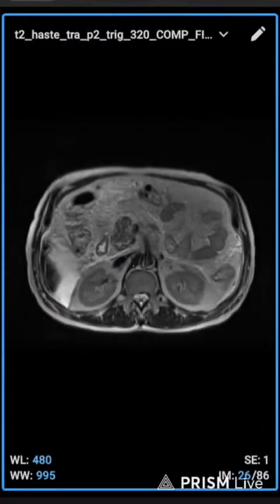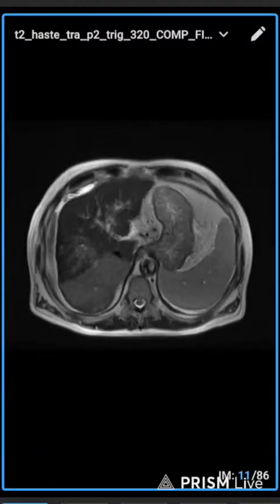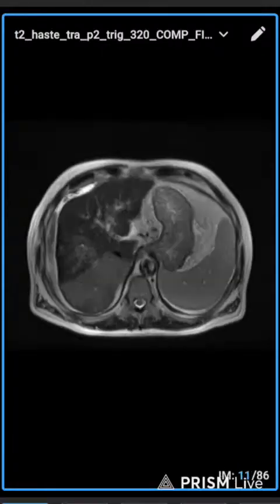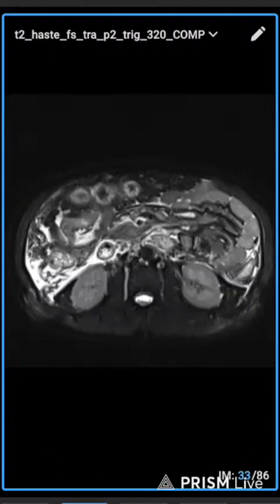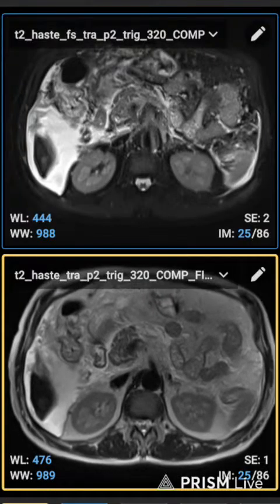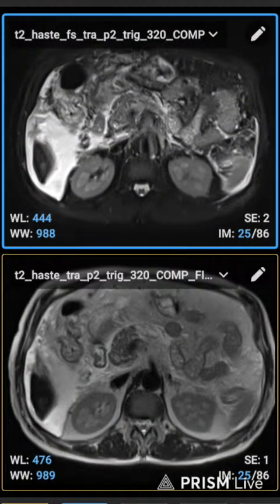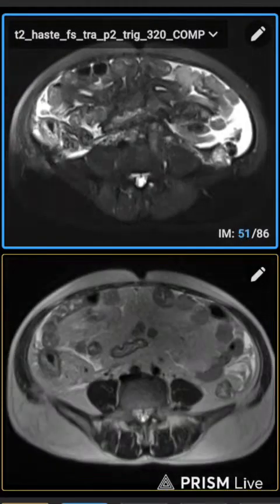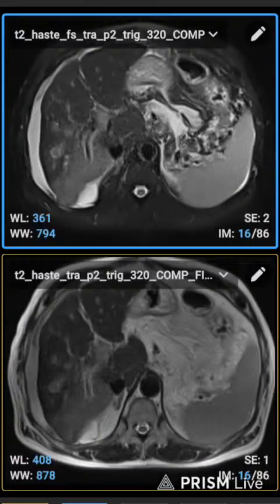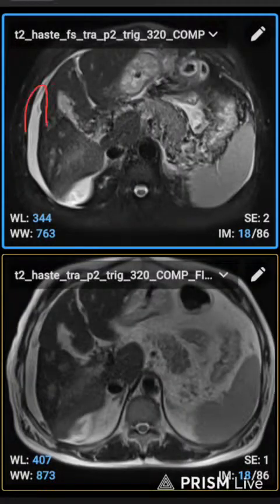Here you can see in the liver, outside the liver, the ascitic collection was seen largely, just because the patient's liver has a lesion. Here is the difference between T2 and T2FS. In T2 we don't properly identify what is a fat, or if there is ascites. In T2FS we find out the large collection in this abdomen. Here you can see every bright signal in T2FS was ascites.